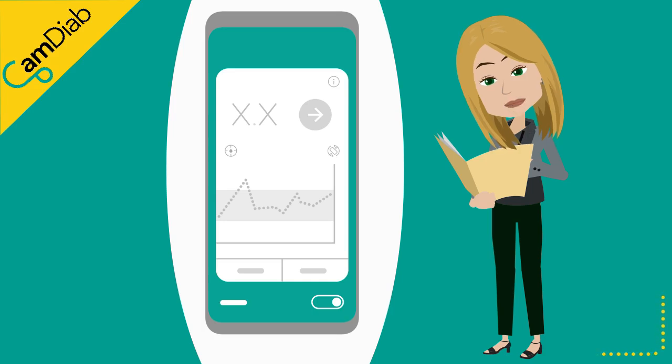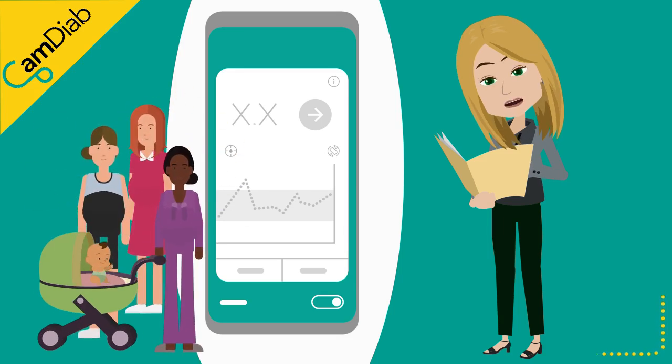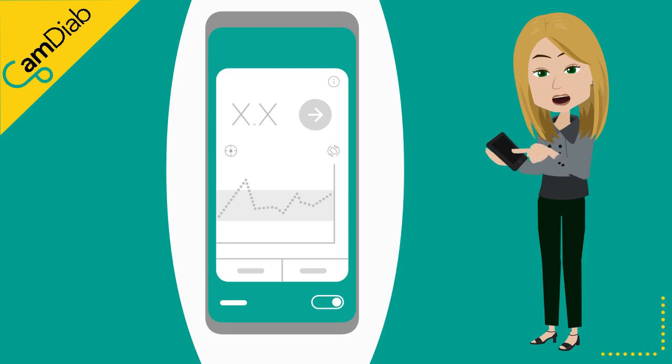Through all the research we have done as well as our clinical experience, we've learned a lot about using CamAPS FX in pregnancy. This short animation is designed to help you get the best out of this pregnancy-specific closed-loop system for you and your baby. There are a few app settings that you should adjust, together with your diabetes team, as your pregnancy progresses.